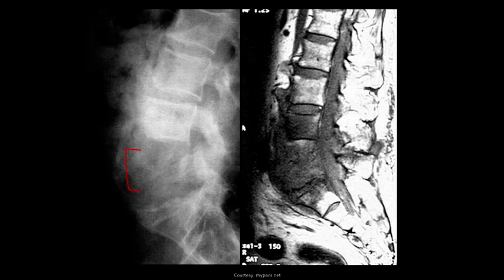The MRI we see here, this is a T1 image. So the MRI here, we can see that there's widespread change, and now we can tell that the discs are a little bit more involved, and we're starting to see some of that destruction in that anterior aspect of the L4 body above it. So this does take us a little bit more, or it's more evidence towards a spondylodiscitis, especially since we don't see kind of spots elsewhere, and it's really only that local area or that local segment, which is much more infectious type change.